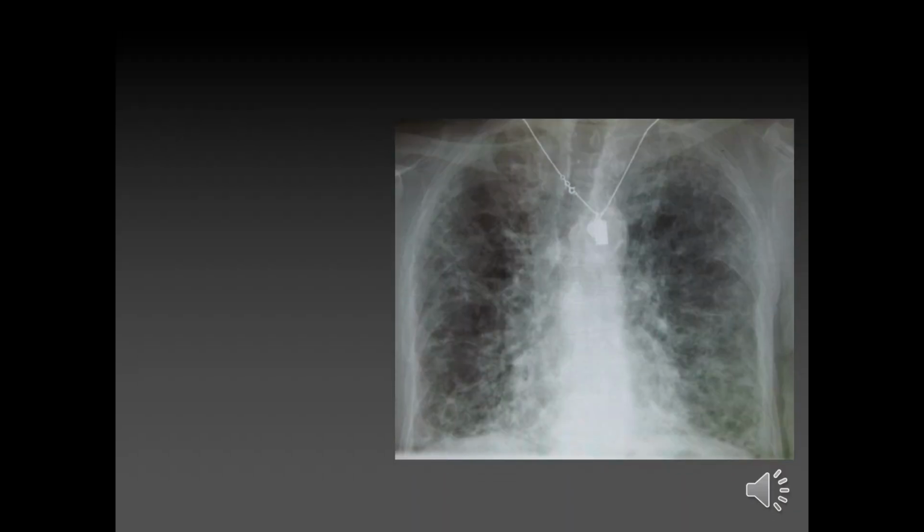Okay. Anyone fancy having a shot at interpreting this one? So from the start, from technical assessment. Well, everyone think about doing it actually. Think about how you would do it, starting from the T. Give it a couple of minutes. I think it probably doesn't show quite as well in your other thing.